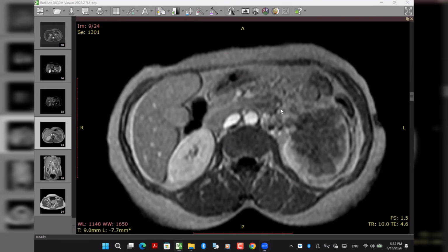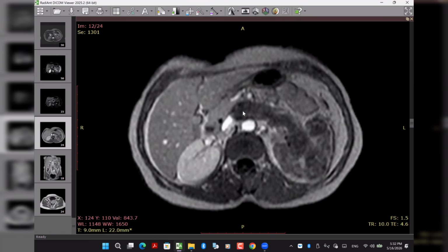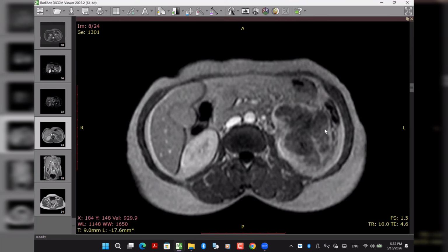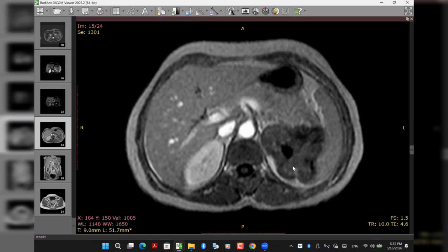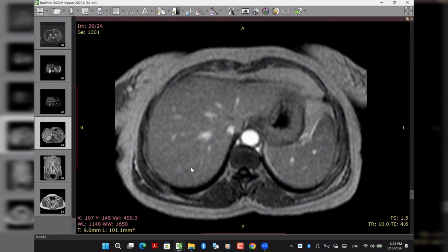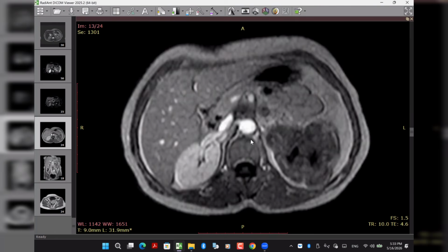So this patient had an isolated left renal vein thrombosis with unilateral enlargement of the kidney. As you stated, there is no enhancement of the vein and there is a cortical rim sign here. And this is an accidentally discovered small hemangioma. Okay, but you described it very well.